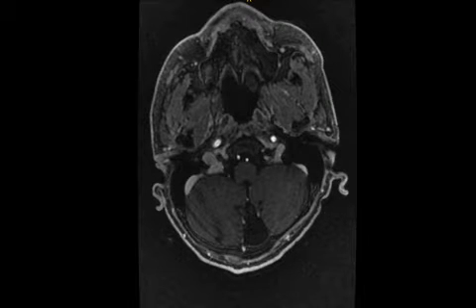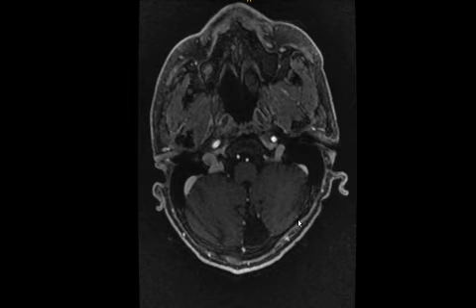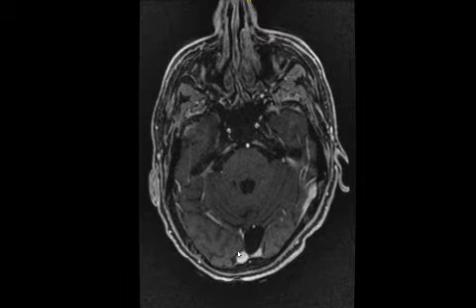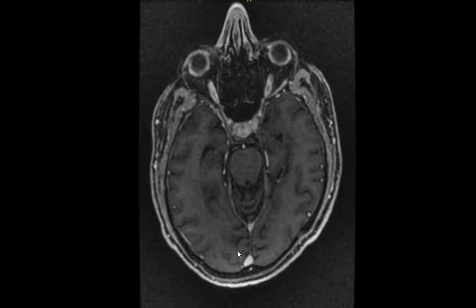We have a contrast here. Come on now, don't load so much. Is it my network? Always the issue with a lot of images being loaded, right?